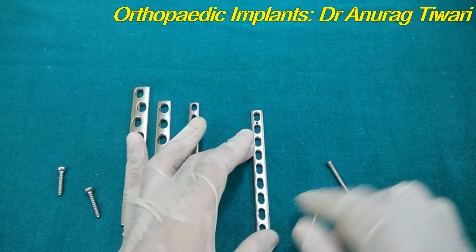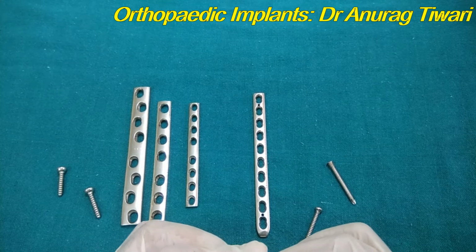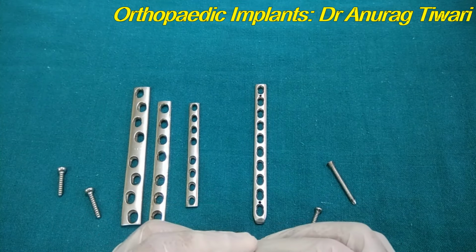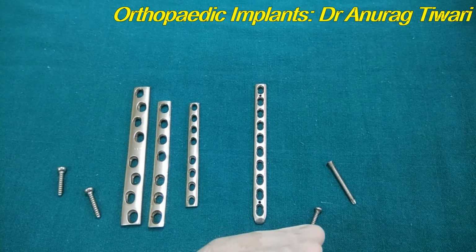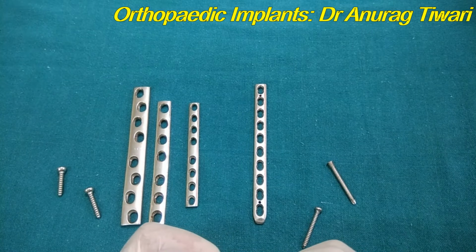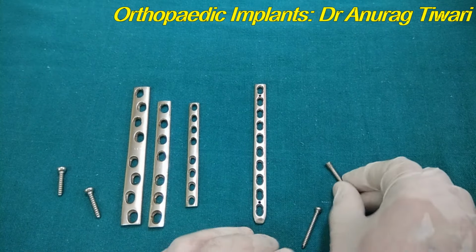The main indications of the locking plate are periarticular fracture, metaphyseal fracture, that is near the joint, or osteoporotic fracture where the bone quality is not good and you need a rigid type of fixation, a good fixation, to have a better purchase of the implant. And the third possibility is when you have a periprosthetic fracture, when you have the fracture near the prosthesis. So these are the basic indications of the locking plate.